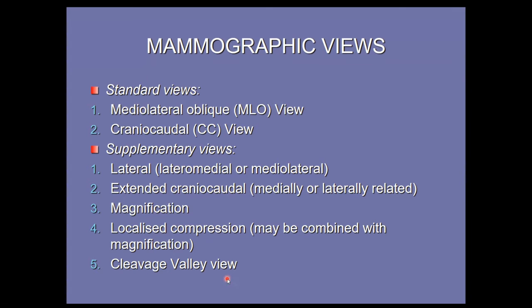Cleavage view: if we take a view of both breasts at the same time in craniocaudal view, then this is called the cleavage view. Because sometimes the mass may be extending towards the other breast from the medial aspect. So in that case, we can perform the cleavage view.